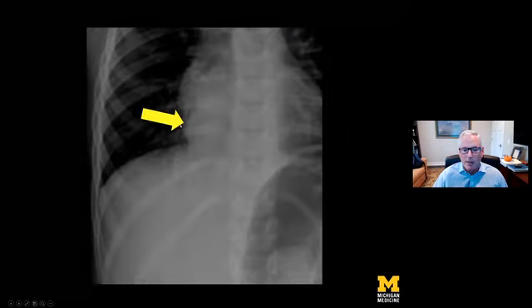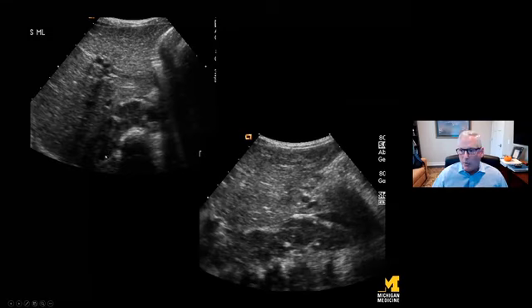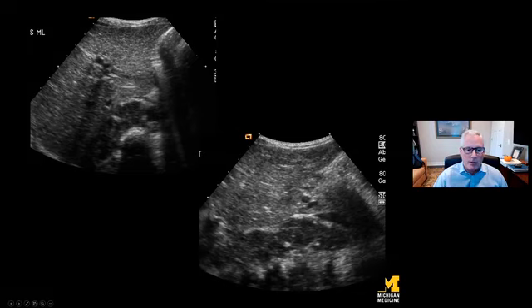So if we look very carefully, we have this line, and we also have this line. And you'll see another example coming up. Neuroblastoma can be within the chest, can be thoracoabdominal, can be within the abdomen. I've seen many cases where it likes to crawl and move retrocrural and then up into the middle and posterior mediastinum, paraspinal in location. On the ultrasound of this patient, we can actually see the aorta encased by tumor.